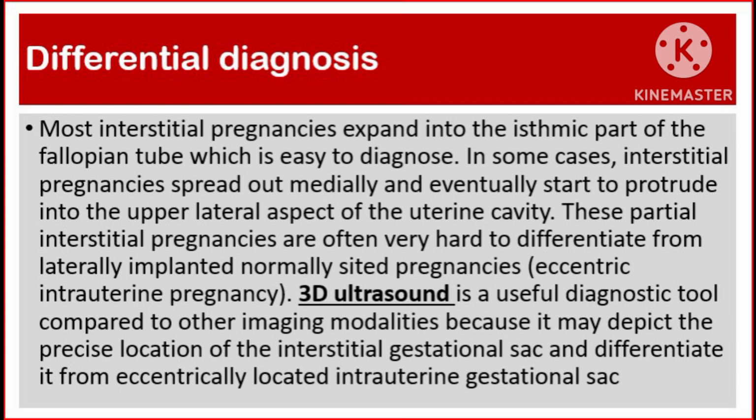3D ultrasound is a useful diagnostic tool compared to other imaging modalities because it may depict the precise location of the interstitial gestational sac and differentiate it from an eccentrically located intrauterine gestational sac.